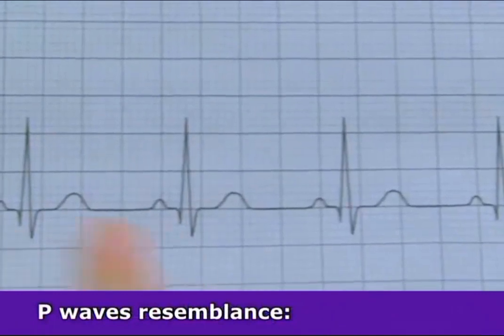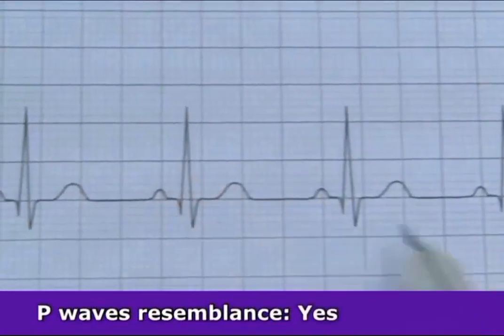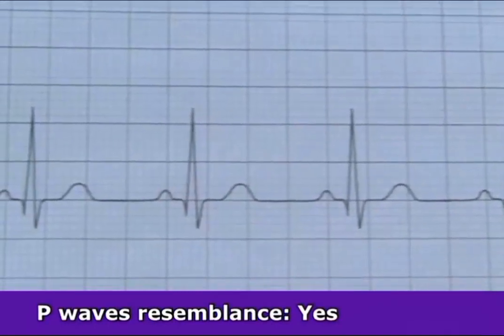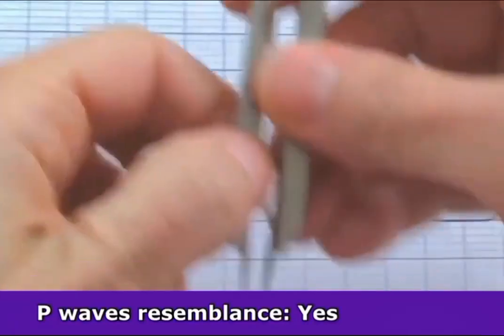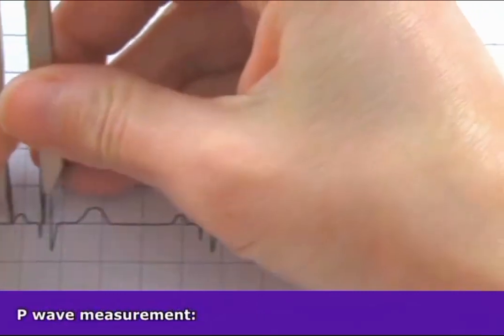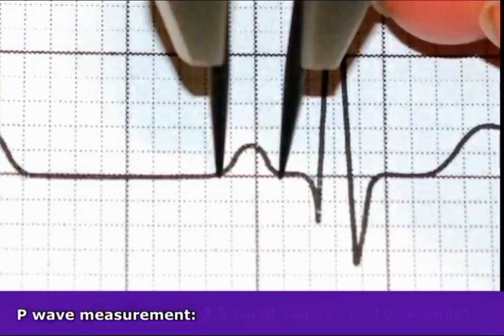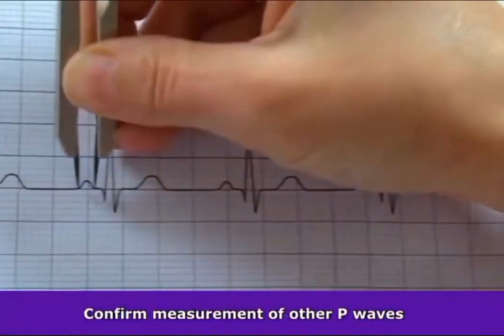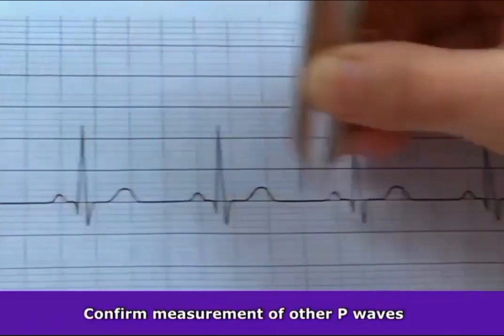Now let's look at their resemblance. Do these resemble P waves? And they do. They are round, they are upright, there's only one P wave in front of a QRS complex. And their duration, let's make sure that they're less than 0.12 seconds. So we're just going to take our calipers, measure at the beginning of that P wave, and at the end of the P wave, and it's about 2.5 boxes, so we get 0.10 seconds. And then just to confirm that measurement, just go throughout all the other P waves and just make sure they all line up with that measurement.